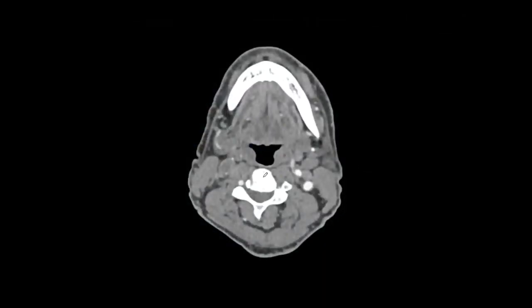But this is regarding the CTA, it's a similar case, okay? So this is an eye test. Do you see the abnormality? I am in the neck, and I can see a vessel with a branch in the neck. A major artery with a branch is usually an external carotid artery, because internal carotid artery does not have branches. And I see both of them on the left side, but I don't see them on the right side, correct?